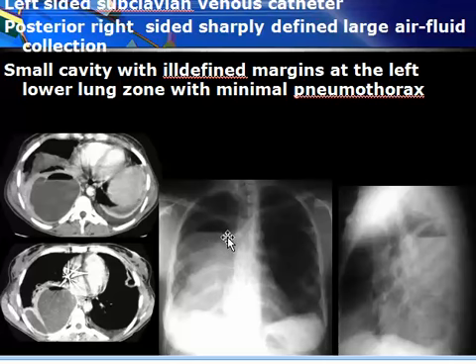Abscess or pleura, meaning is it pulmonary or extrapulmonary? Simply there is split pleura sign, there is thick outline, there is enhancing outline, there is air within, there is compressed lung tissue around, and there are loculi, and there is another one there confirming the presence of multiple empyema. Of course, here we can find minimal pneumothorax on the left.